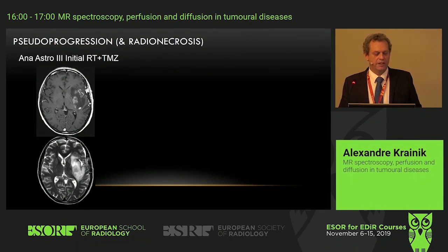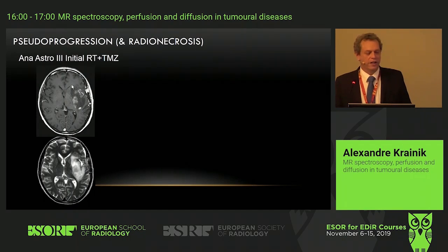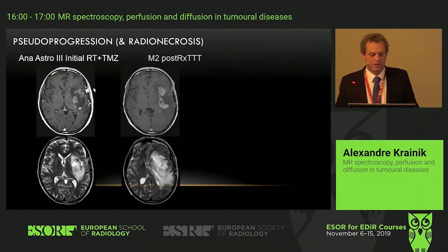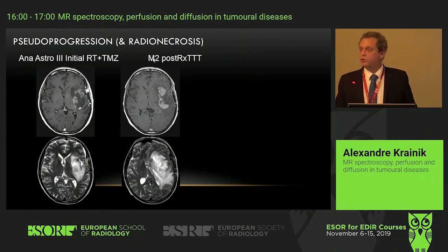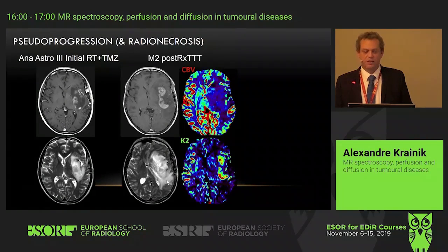And here is a patient referred for an anaplastic astrocytoma, and it was decided of radiotherapy and temozolomide. And you see this tumor with certain foci of contrast enhancement. You see the tumor, how it looks 2 months after. So there's an increase of contrast enhancement. The edema has also increased.